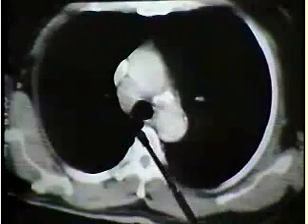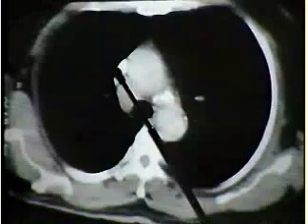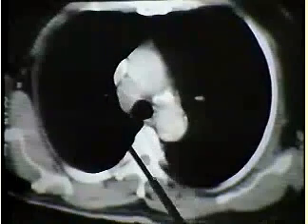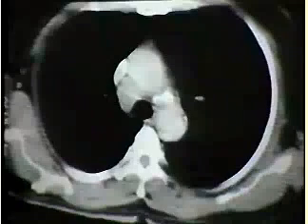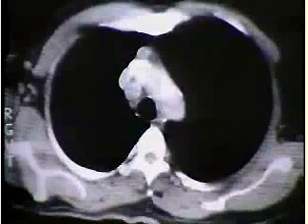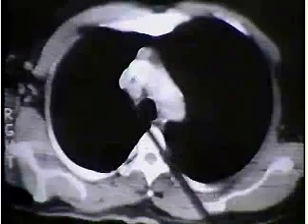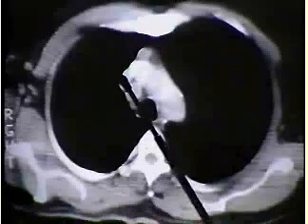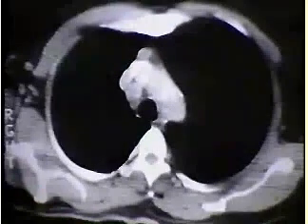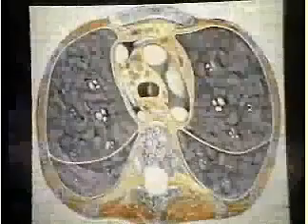And this soft tissue mass extends sufficiently far laterally either to be border forming or to push the superior vena cava locally into becoming convex. This, of course, is an abnormal shadow, and if we go a little bit higher up, we still see that there is a mass shadow over here in the fat pad between the right brachiocephalic vein and the trachea. What is this? Well, it's a large lymph node, and in this case it happens to be due to tuberculosis, which is not an unknown disease in this area.